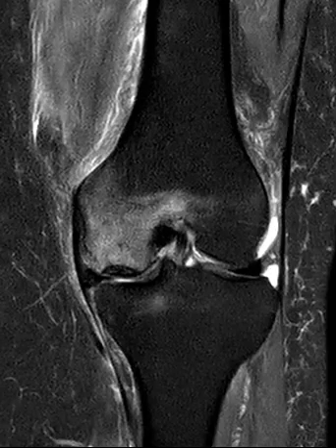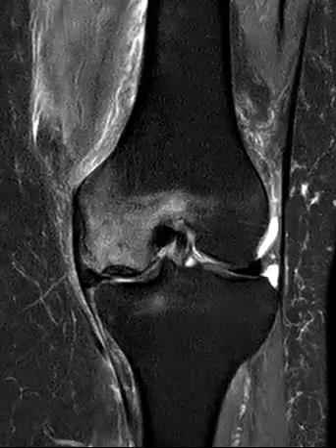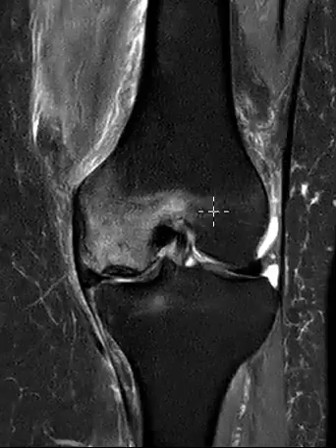Hello, this is Dr. Gay from First Look MRI, and this is a 69-year-old female with complaints of knee pain. This is just a very classic standard pattern of pathology we see.